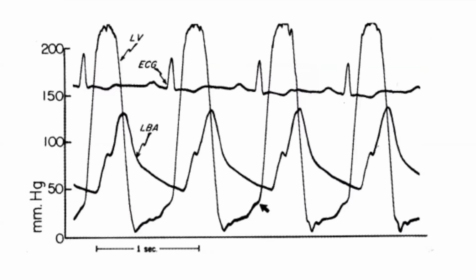The idea here is the valve doesn't close. Therefore, you don't get a dicrotic notch. The pressure continues to drop freely and precipitously throughout diastole, including early diastole. In chronic AI, the arterial compliance improves and you may get a dicrotic notch from the arterial elasticity. That's why you may not lose it in chronic AI, but you do lose it in acute AI.